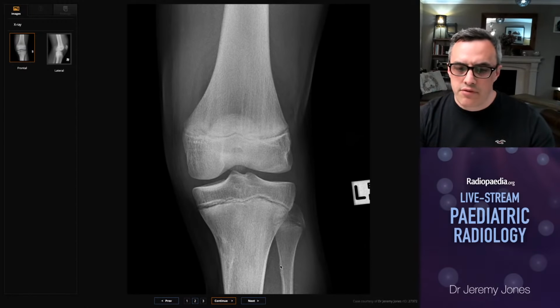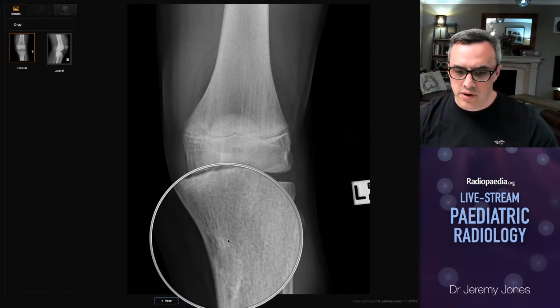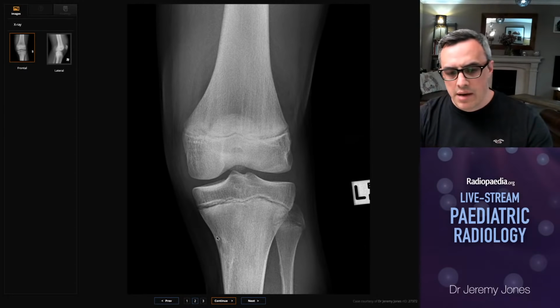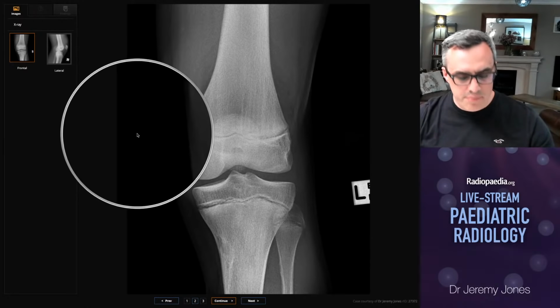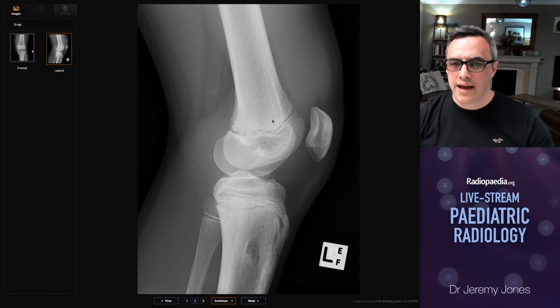If you're watching the live stream from Matt Skalski on Monday, you will have seen him drawing one of these, or at least copying it from another X-ray. This lad's got a large non-ossifying fibroma on the medial portion of his proximal tibia as well. We know it's that. It's got classical appearances. It's cortically based, eccentric. It's got nothing to do with his presentation, needs no further examination. Can we see why he's sore on the AP? We can't. But you've probably noticed already, just from the thumbnail, that something is going on in this lateral. We're going to get to that next.